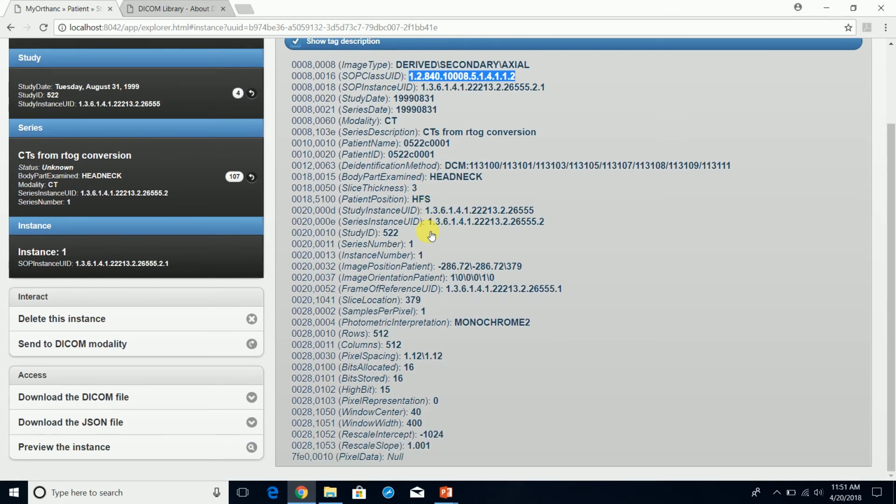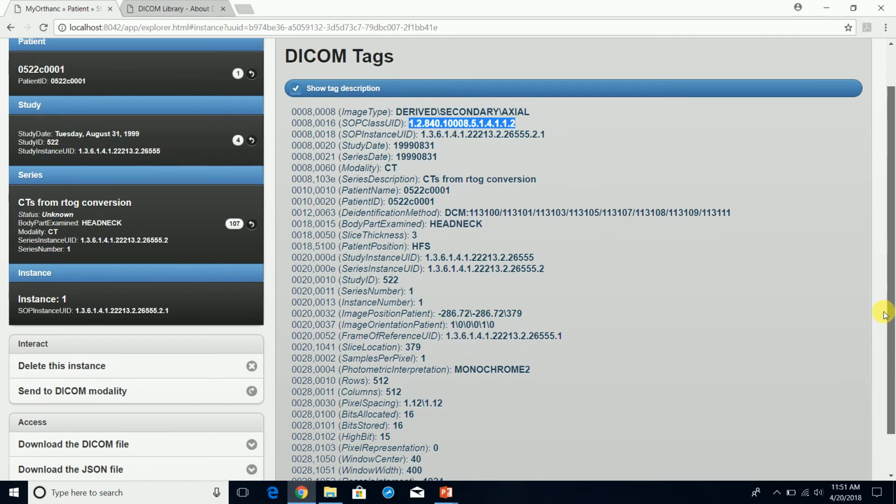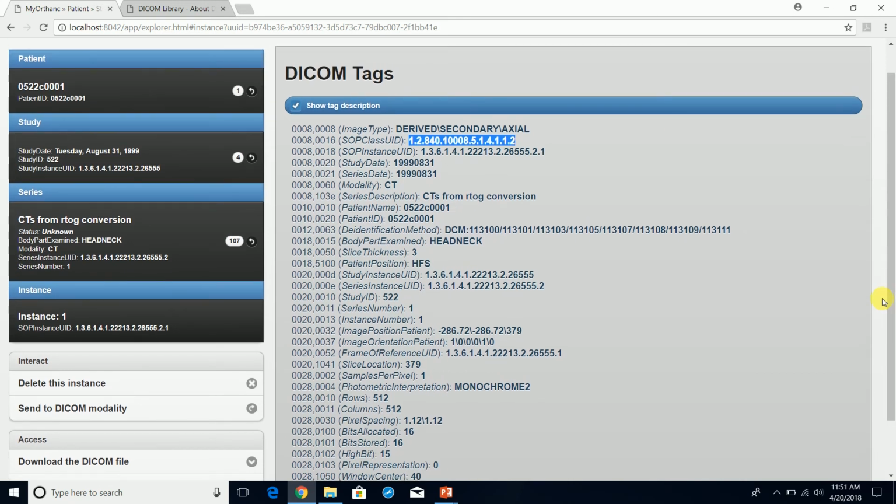And so this is a good way to familiarize yourself with the different DICOM tags. Again, this stuff is going to be very useful for you when this type of training comes up. You can say that you familiarized yourself with DICOM tags, you have experience with that.